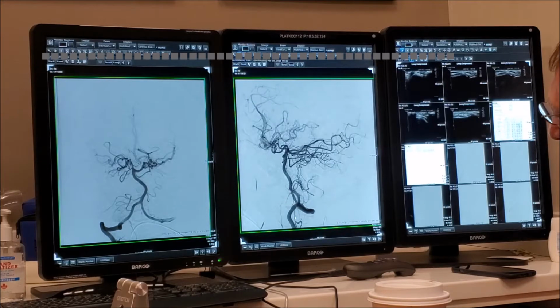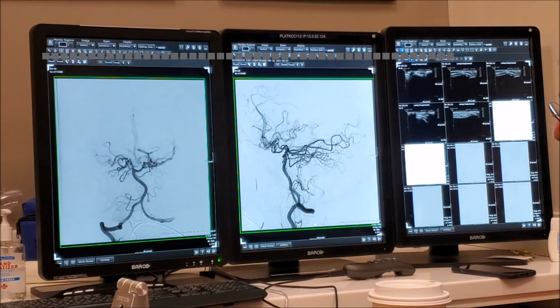There is another artery, another vessel here, and another vessel here, right? Another vessel here, another vessel here. Could we tell who they are? Each one of them. This one here, yeah, this one is probably a branch leading to anterior spinal. From where? You said anterior spinal? It's going to form anterior spinal.